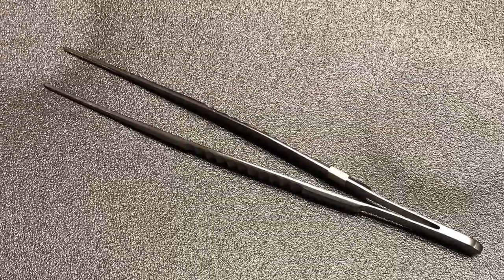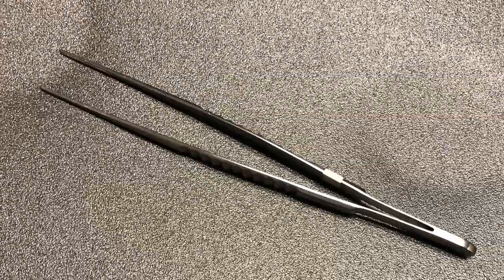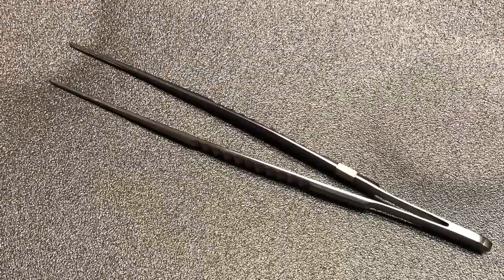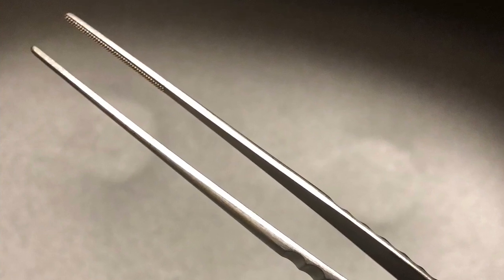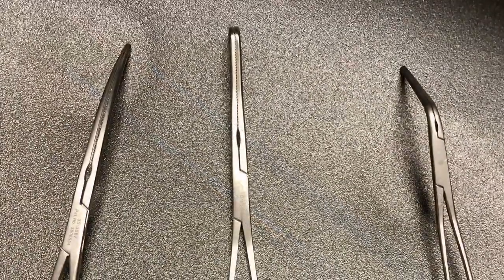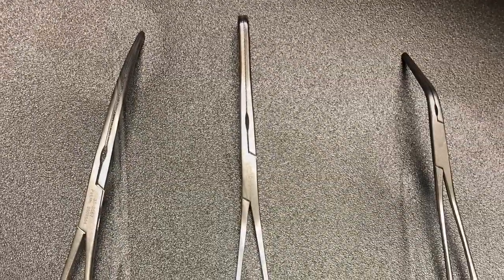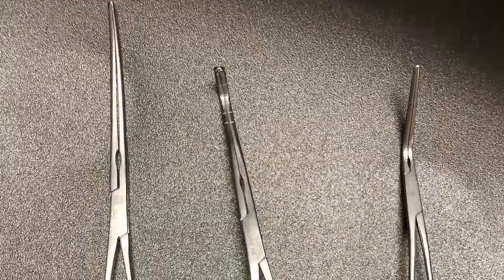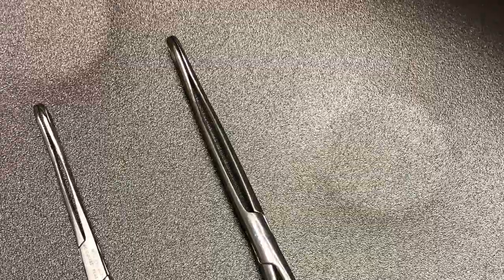These are used in most vascular procedures, or in any procedures to grasp when you wish to avoid tissue damage. These tissue forceps have a ribbed grip panel along the forceps ends. Cardiovascular or CV clamps, designed to control blood flow like the bulldog clamp, allow you to establish a repair of a blood vessel without damaging the vessel.